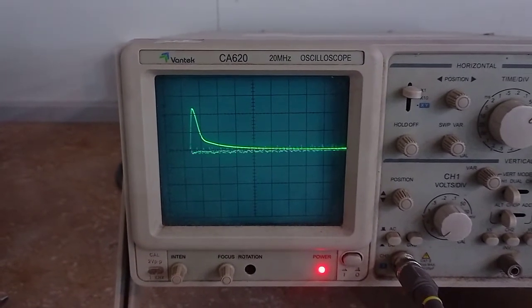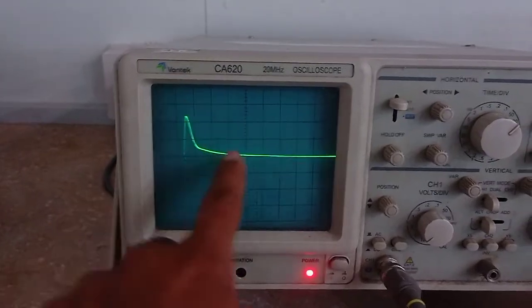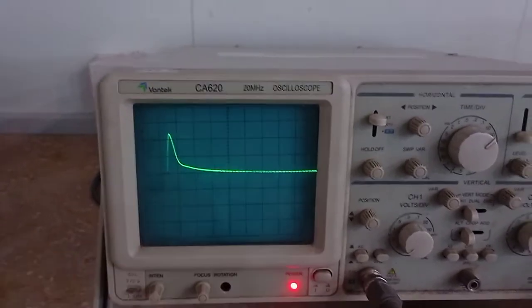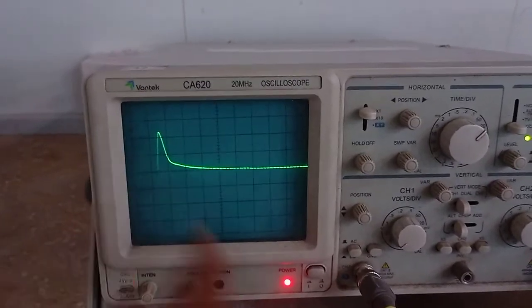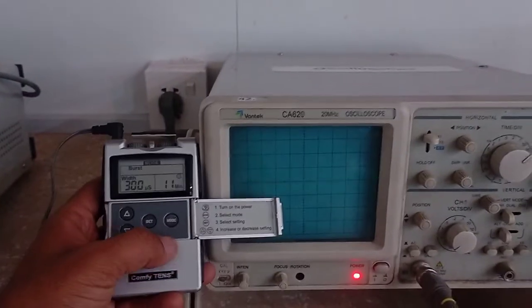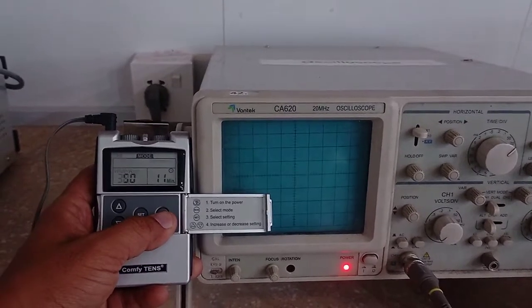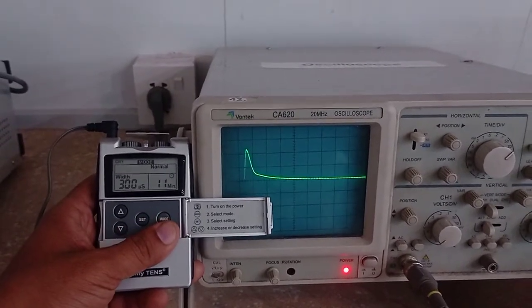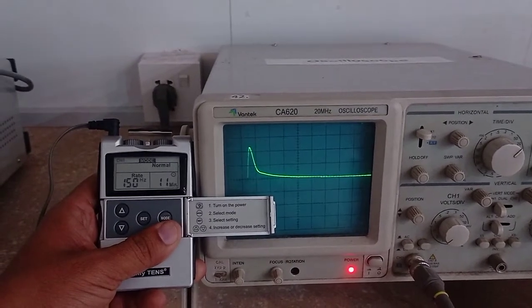So in the normal, this waveform is just sustained, so there is a sustained contraction and then relaxation, then contraction and relaxation. But when it was burst, I will turn the unit to burst again. So here I will keep them side by side to each other, and this is the appearance of burst. Okay, as soon as I press the normal, now you see there is no burst, or there is just normal waves.